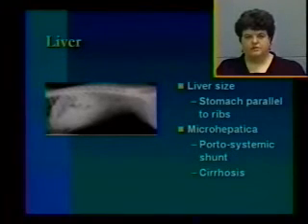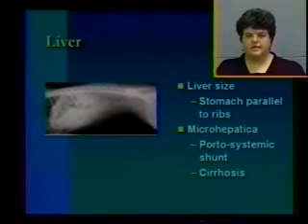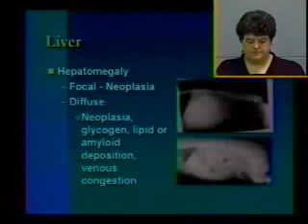Causes of very small liver include portosystemic shunt in little dogs, or long-standing chronic active hepatitis where they actually have cirrhosis and fibrotic changes. You can also have changes in the opacity of the liver. It's a homogeneous soft tissue opacity typically, but if you actually have air in the biliary system or air in the gallbladder, that's something that gives you an idea that you really need to actively pursue an infectious emphysematous disease in the liver that is going to need immediate attention.